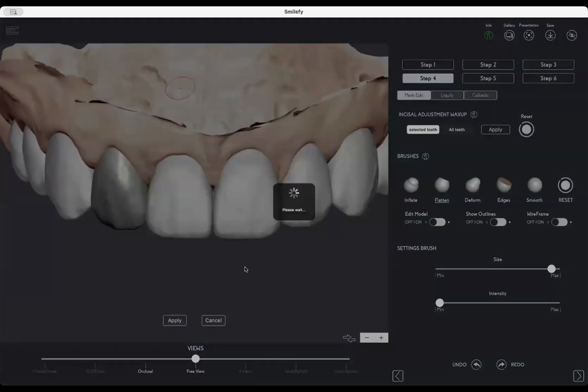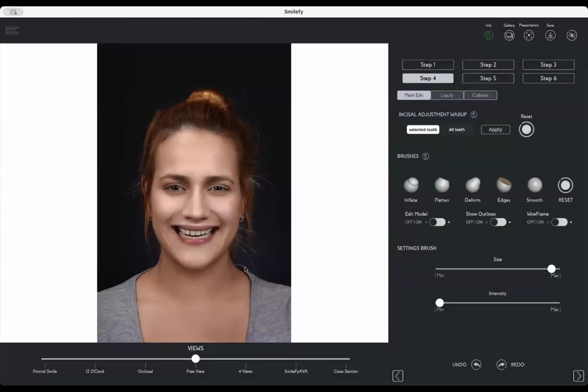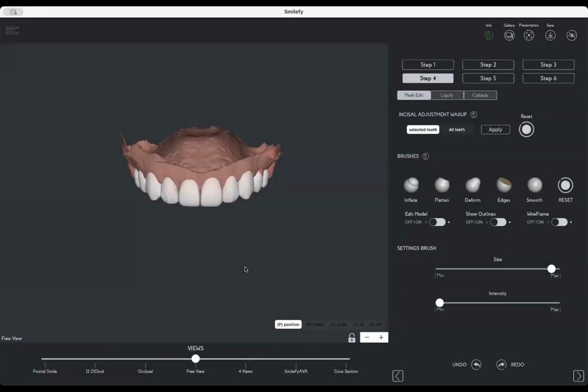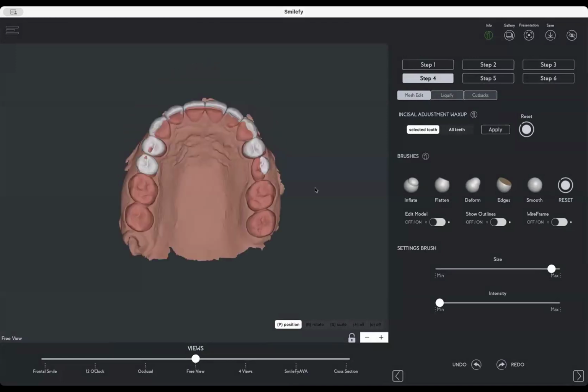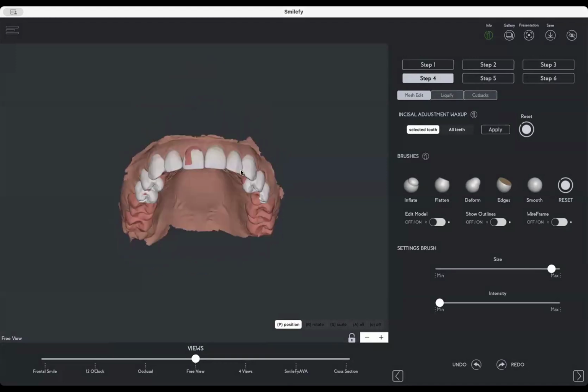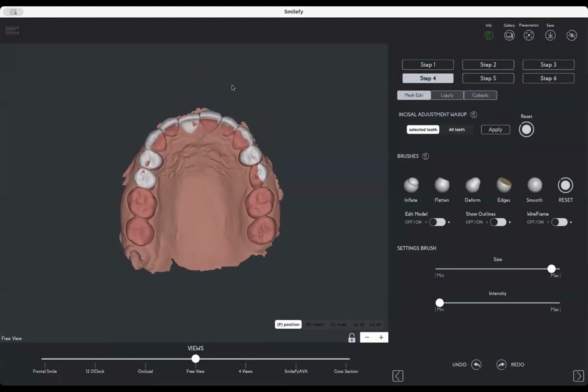Now, what is the difference between motivational mockup, additive, and the ideal design, which can be additive and subtractive, right? So if we design, for example, a subtractive case, we want to have the ideal occlusal curve. The subtractive case will be like this. So we try to set the incisal edges, and we try to bring the smile as close to the patient's incisal edges.